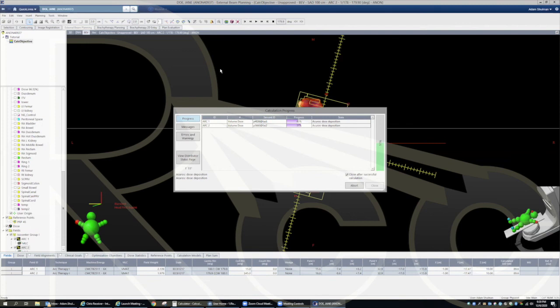And the reason, there are a couple reasons for that for anyone listening to this. For the lung, one, you have better buildup into the lung portion of the PTV with 6 MV than you do with 10 MV. And then your beam modeling will be better.